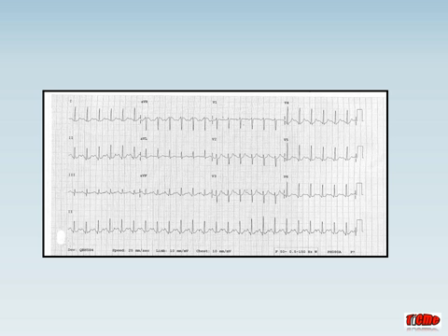Now, the other factor we need to look at, apart from clinical factors, is the morphology of the ECG, and the P wave in atrial tachycardia tends to come earlier than it would in sinus rhythm, because they're essentially atrial premature beats, and so you can see here that the P waves are occurring almost on the back of the T waves. The other thing is that the morphology of the P wave will be different to sinus, because the location of the depolarization inside the atria is different, so the P waves will look different. If you're lucky enough to get someone who has atrial tachycardia and reverts to sinus, then compare the morphology of the P waves.